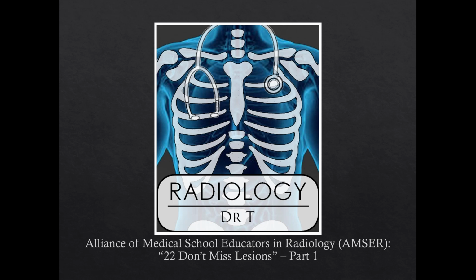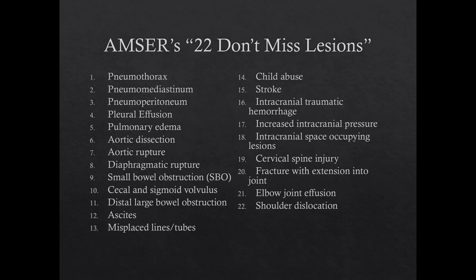Welcome to part 1 of our series covering AMSER's 22 Don't Miss Lesions for radiological interpretation. Listed on this slide are the 22 lesions identified by AMSER as some of the most important radiographic findings for all physicians to know, whether they practice radiology or not. If these lesions are caught and appropriately addressed, potentially catastrophic complications can be avoided.